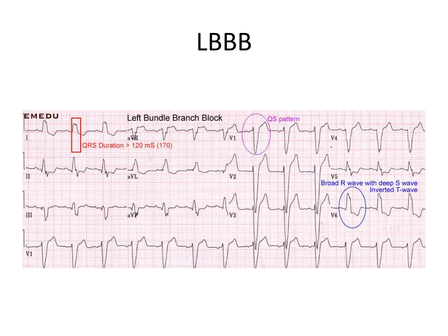The final thing that identifies the EKG as a left bundle, and this is more of an experiential thing, is that you can see that the QRSs, especially in the precordial leads, are asymmetrical. So look, for example, at lead V2, the R wave, the positive one, begins upwards, and then it goes almost vertically straight down, and then comes back at a bit of an angle towards the ST segment. This is not going to be the case with things like VT, which are more symmetrical.